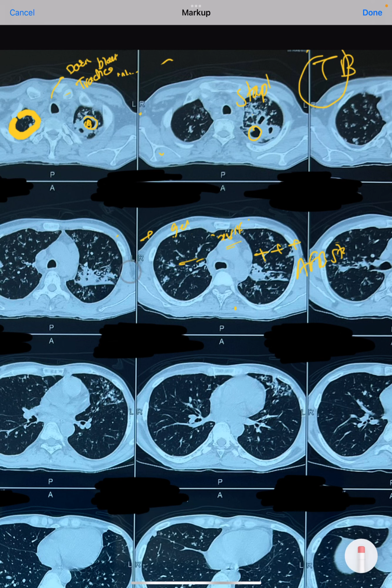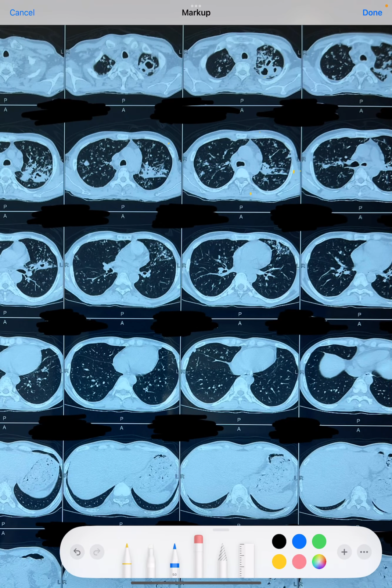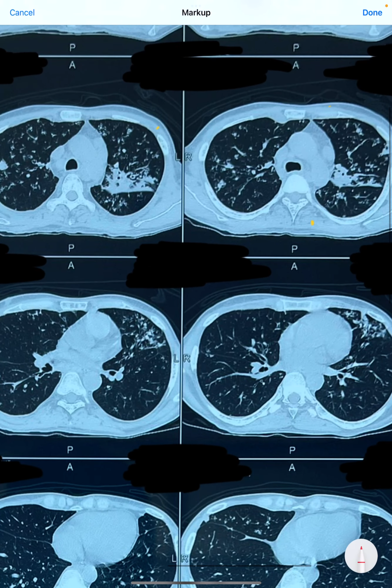So we should think that this may be staphylococcus if the sputum is negative for AFB stain or Ziehl-Neelsen stain, that is for tuberculosis. Now, what other things we can see in this particular CT scan is there is one dense white patch which we can see on this left lung field. Such a patch can be one of two things. It can be pneumonia, or it can be a fibrotic patch because of the old infection.